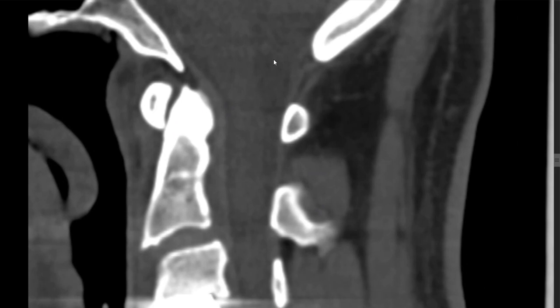So I'm going to do a couple things here. So this is a Grabb-Oakes measurement, which we take from the dura, which is right there, and it's pretty big. So it's possibly at that, so 9 millimeters is, you draw the line at 9 millimeters.